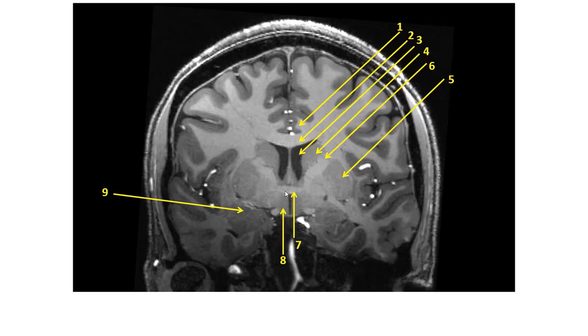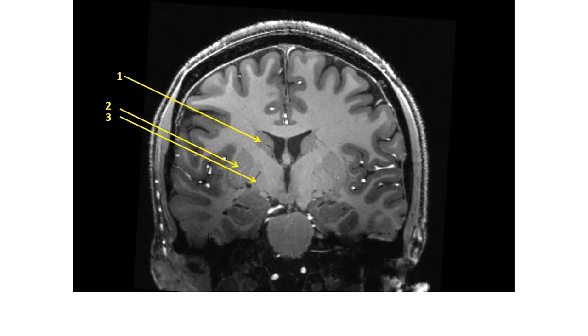This right here, number 7, we didn't discuss in this video, but it's the anterior commissure. It's sort of like the corpus callosum for the temporal lobe, connecting these two lobes together. 8, midline structure sandwiching the third ventricle, and we're fairly far rostral. That's the hypothalamus. If we're in line with the hypothalamus, that means that's amygdala right there, number 9. So we're more caudal now. Lateral to the lateral ventricle is caudate. Lateral to that, 2 is putamen. Medial to the putamen, globus pallidus.